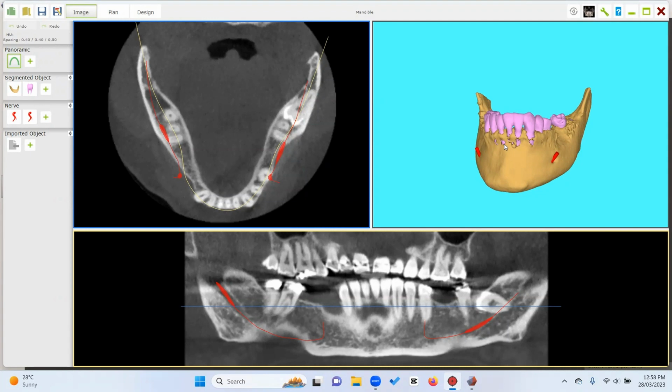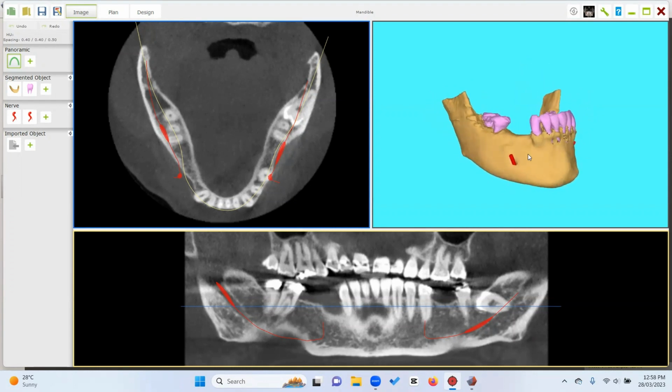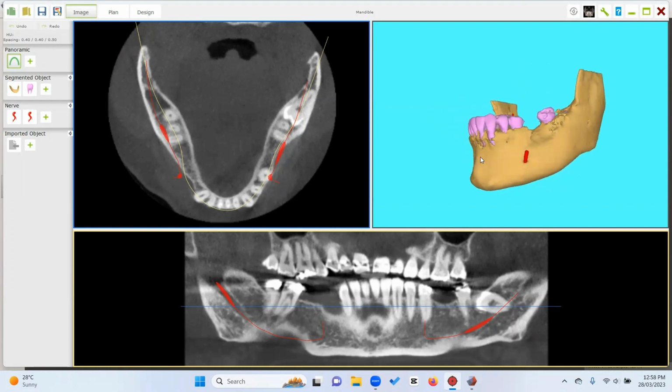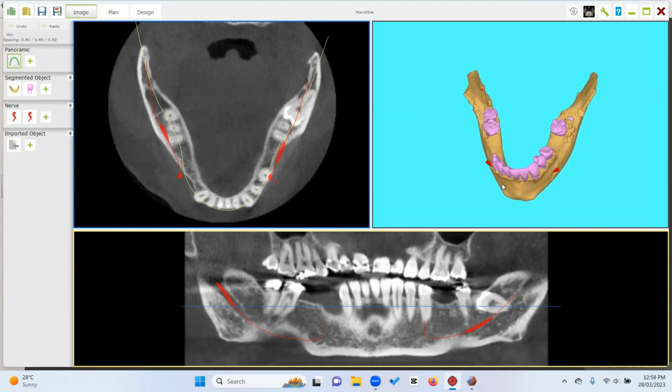In some cases, you need to work on the teeth and on the bone. As long as you overlay the plaster cast of the patient over the CT scan of the patient, you will involve the teeth and the soft tissue at the same time. For this reason, you are not able to work on teeth and bone, and this was impossible until Arshad Alam has been able to find a way to do it.